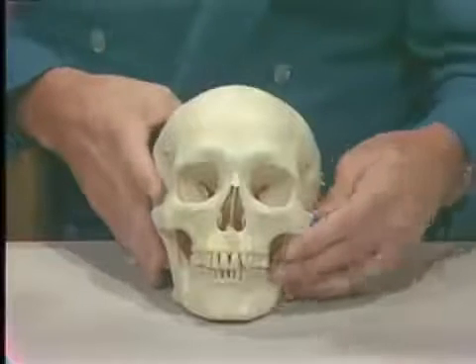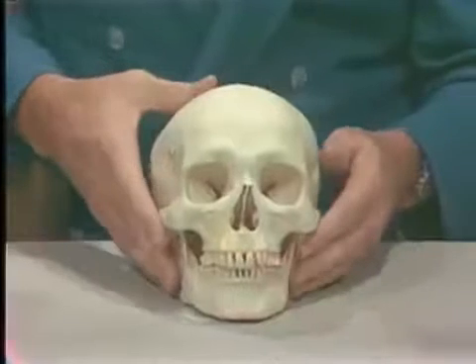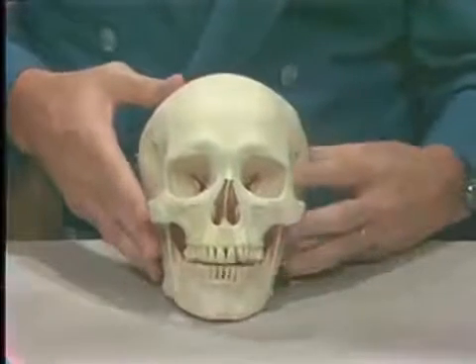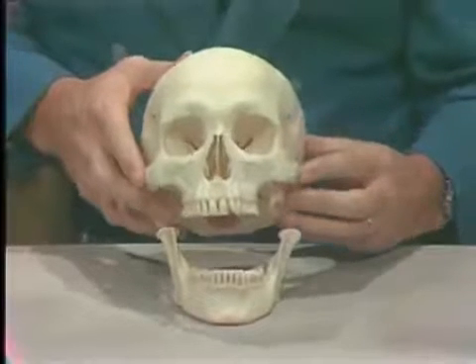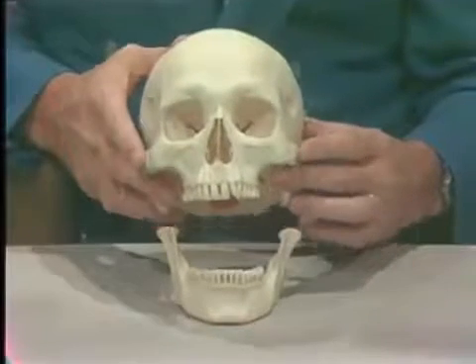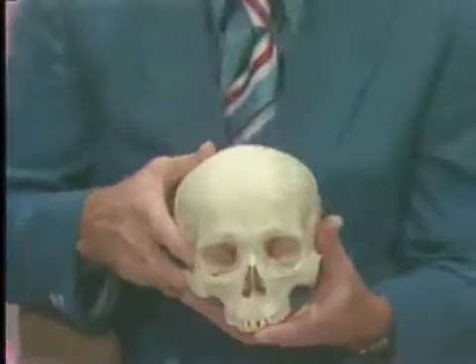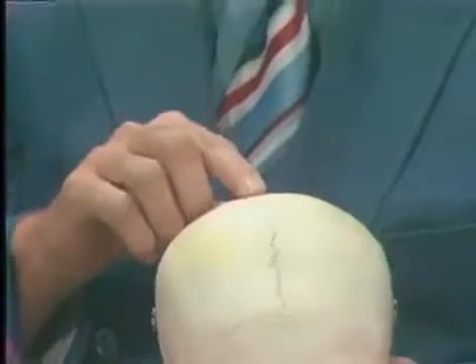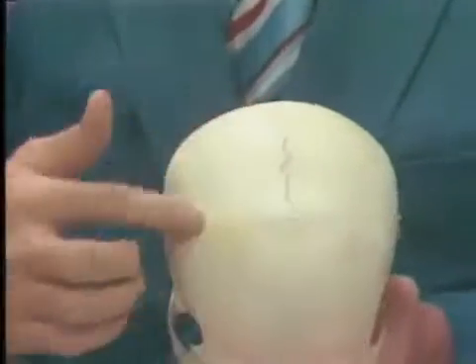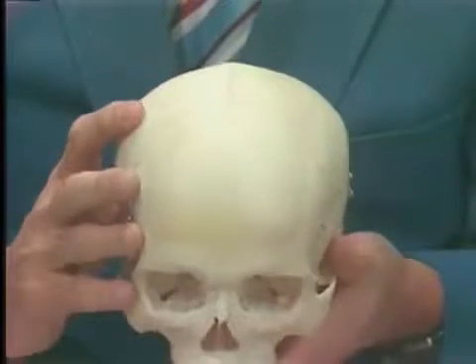The purpose of today's talk is to discuss with you the various movements of the mandible and the planes in which they move, and then relate this to the articulator and the analysis of the movements on the articulator. It was demonstrated to you the movements in the jaw, and we'd like to relate those to the various planes in which they move. This is the mid-sagittal suture and the coronal suture of the skull. And the mandible moves in relation to these planes.